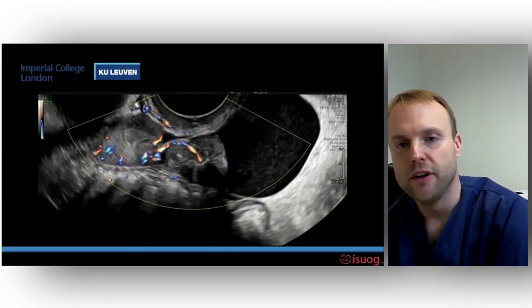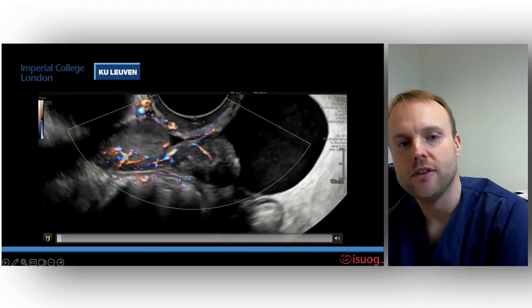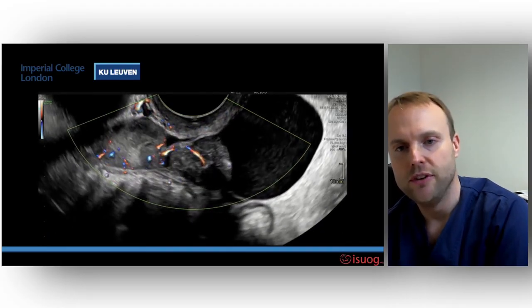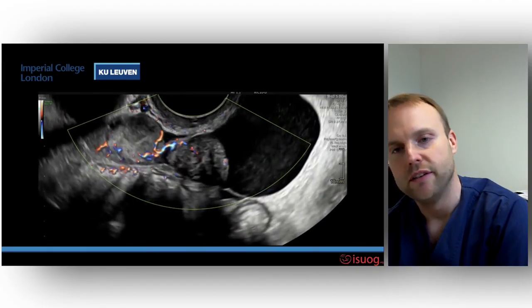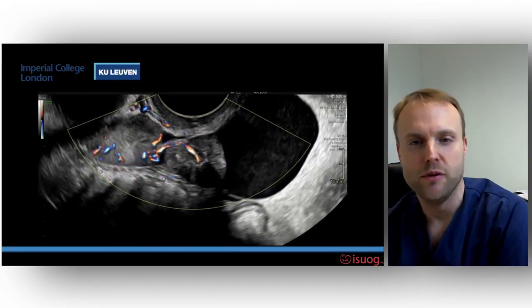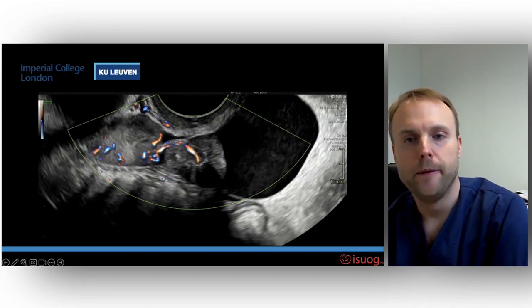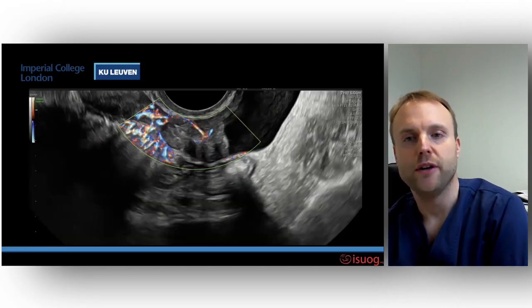Behind the solid component, you can also see, in the direction of the ultrasound beams, some loss of acoustic signal, so we see the stripy shadows. There are some hyper-reflective areas inside the solid component, and behind that, we can see acoustic shadowing. So we have a lesion that contains cystic and solid components with acoustic shadowing.